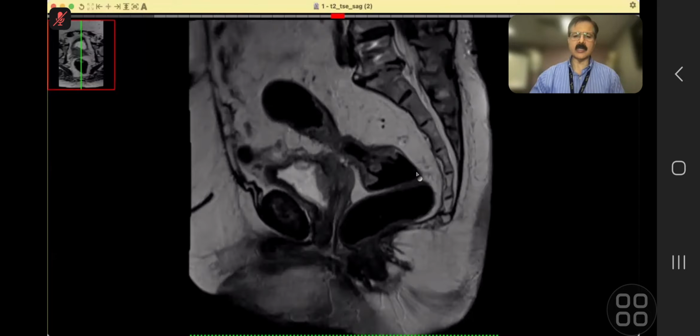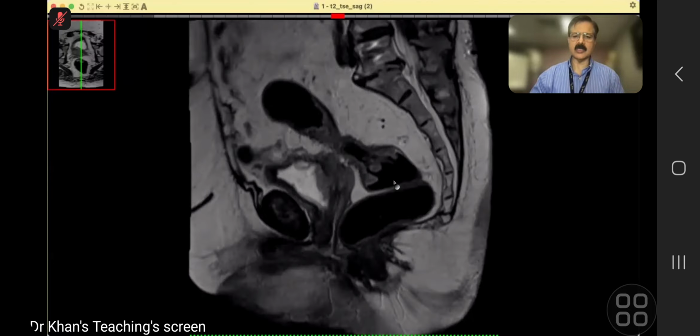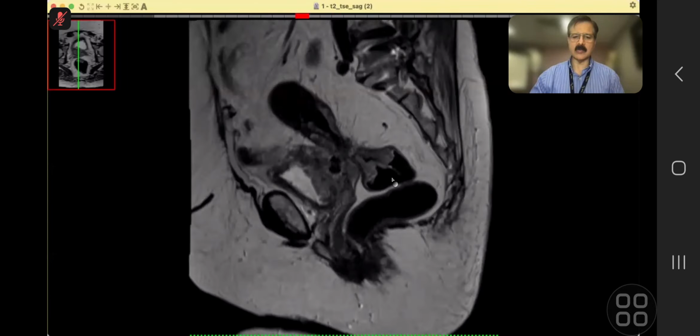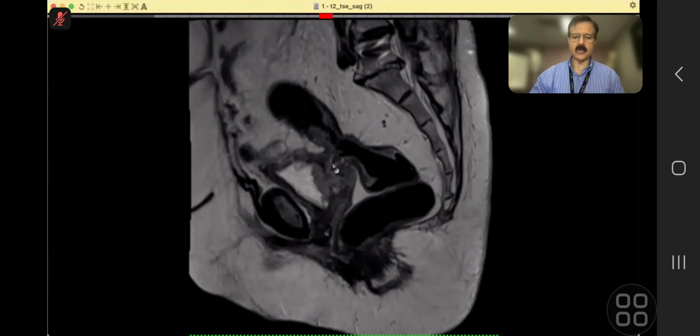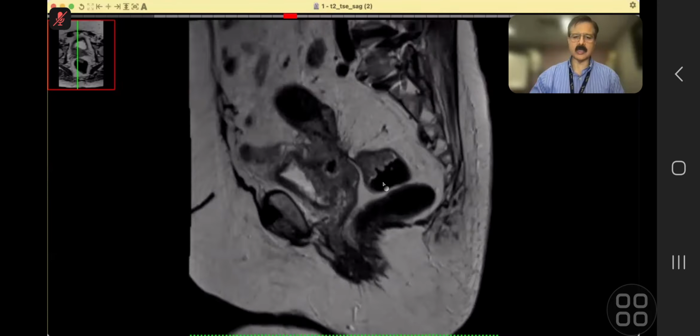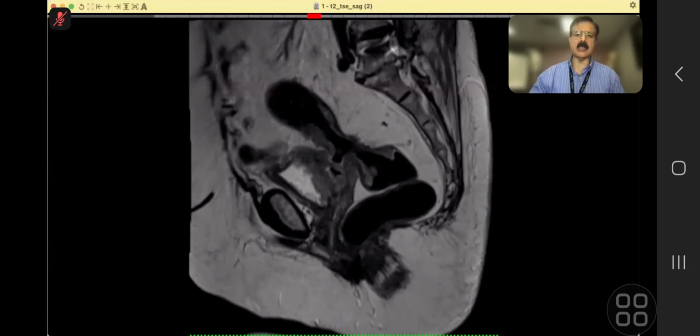As I pointed out, if you say that this is most likely a recurrent tumor with secondary invasion, I will accept it, no issues. But actually, this was a sigmoid primary, a second primary unfortunately, with these fistulous communications, as elaborated. So this is what it is.